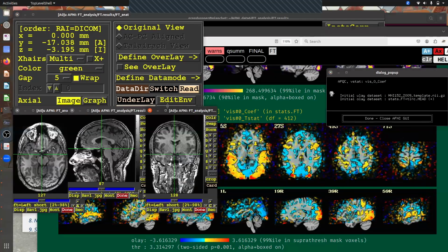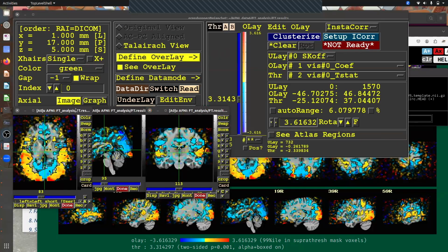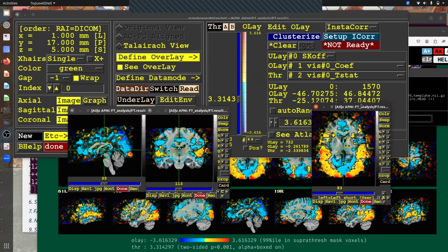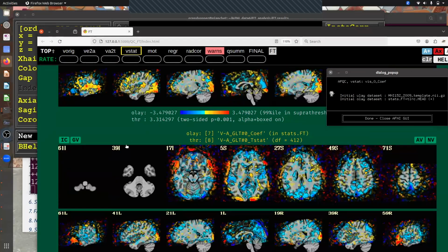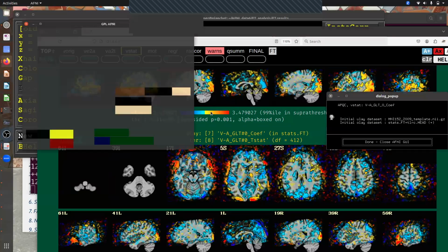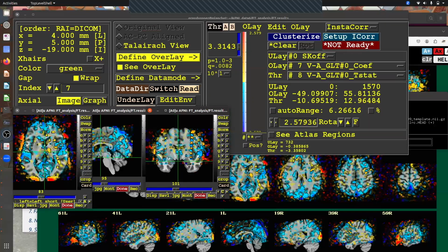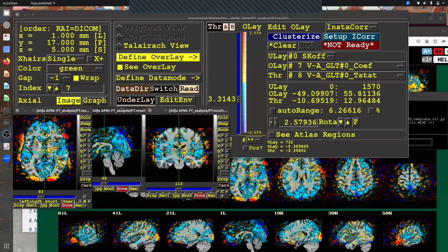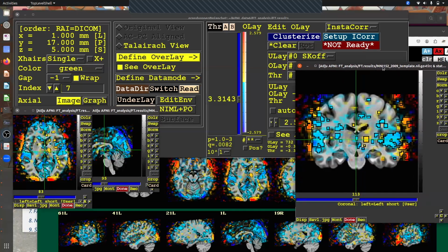Yes, if we look at it here, you can choose to threshold. This is just the pure visual one. Let's see, the one we're looking at was this. Here, you can threshold and choose to only look at positive or negative. In contrast images, most people look at both. Most of the time people are asking where there is a difference between audio and visual.